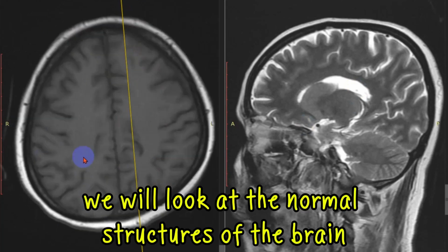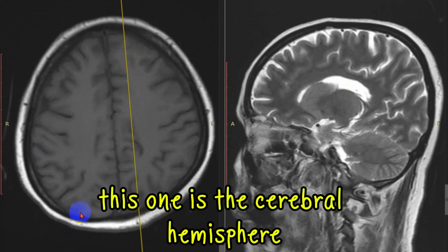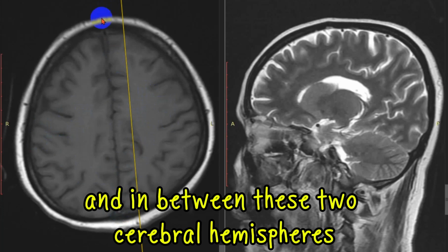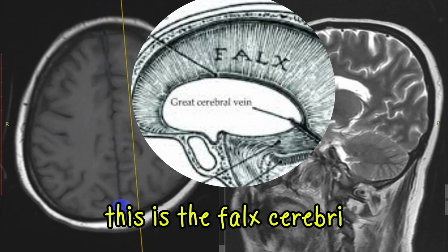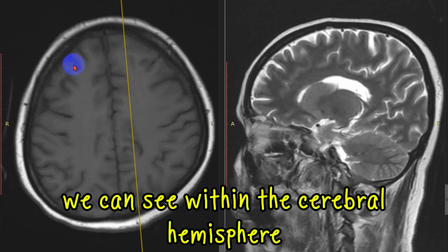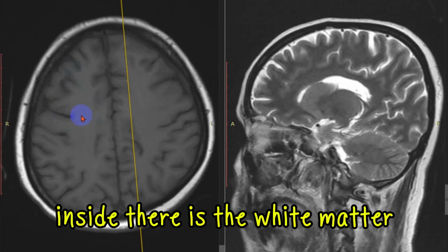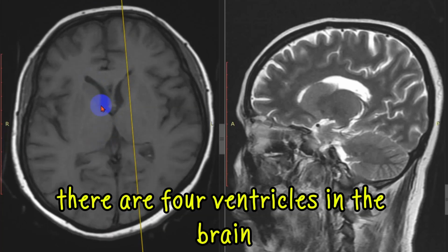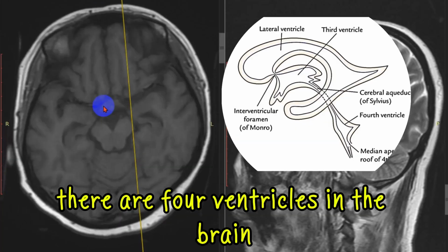First of all, we will look at the normal structures of the brain. This one is the cerebral hemispheres. We can see this is the left cerebral hemisphere, this is the right cerebral hemisphere, and in between these two cerebral hemispheres, this is the falx cerebri. And we can see within the cerebral hemisphere, the inside is the white matter and the outer part is the gray matter. Now the ventricular system, there are 4 ventricles in the brain.